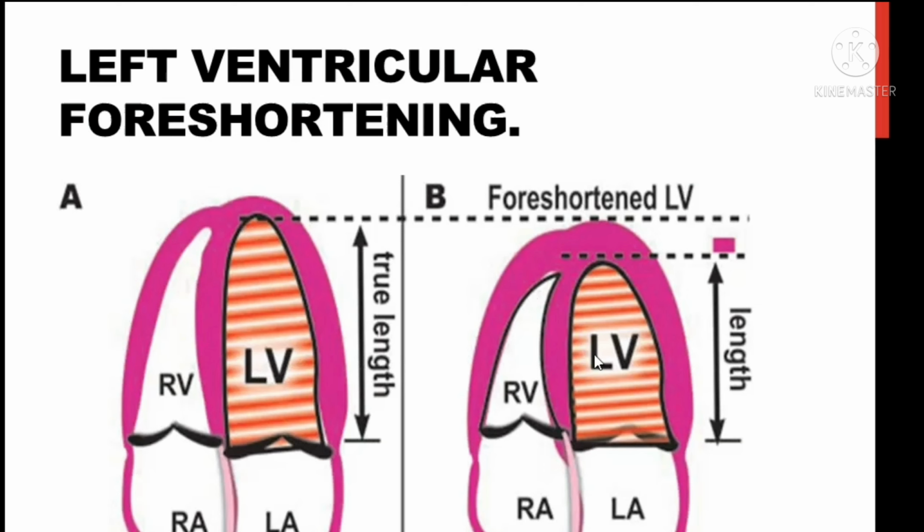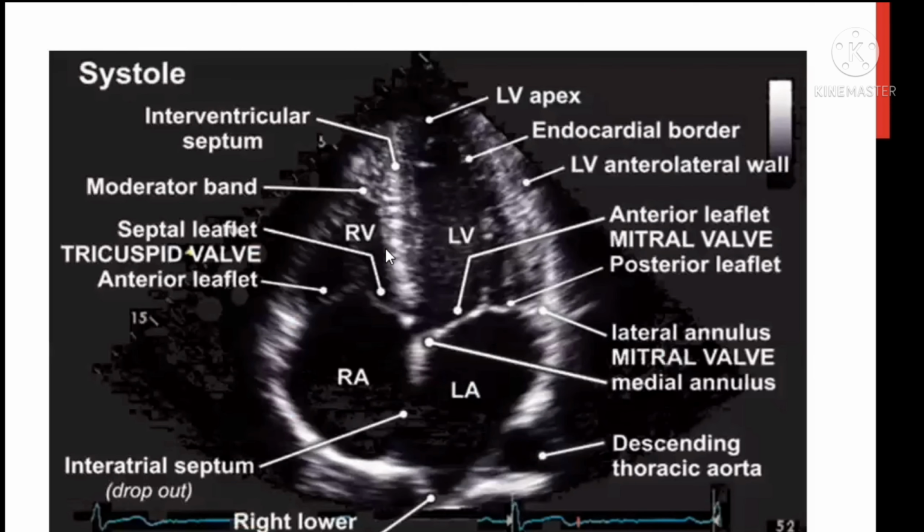The problem of this, especially for cardiologists using ejection fraction assessment with Simpson, is that the volume will be underestimated, so the ejection fraction will be depressed if you don't get the whole left ventricle.